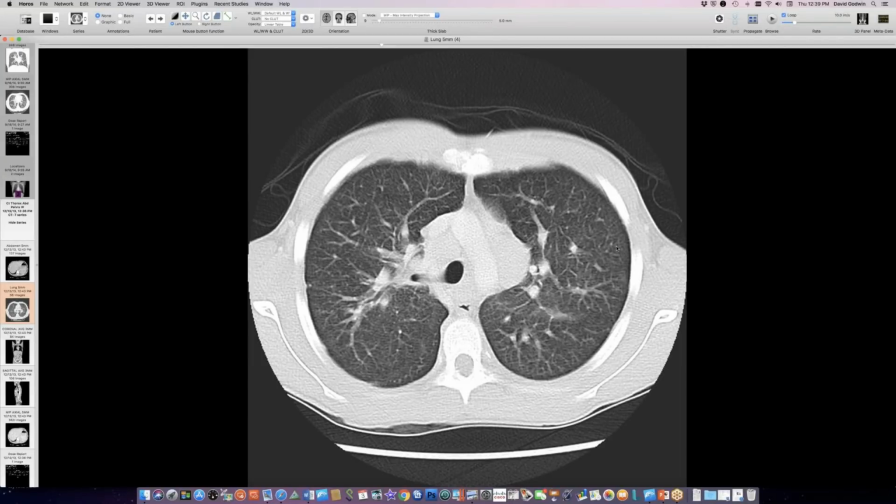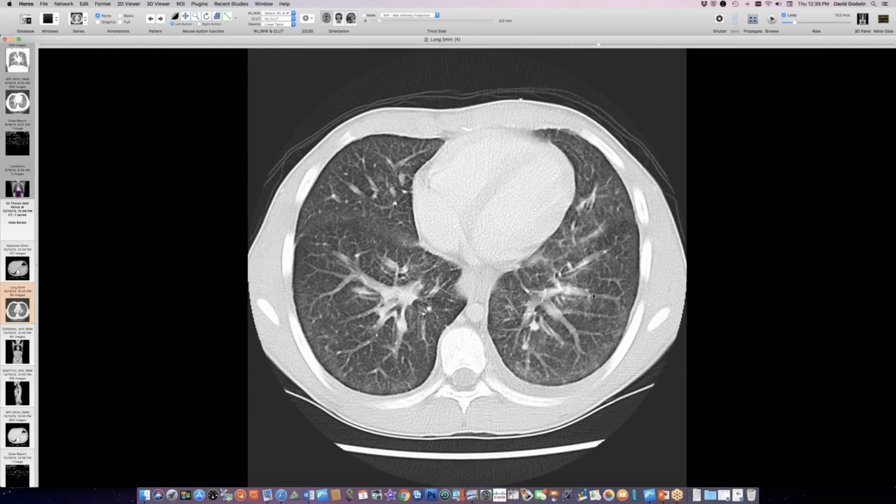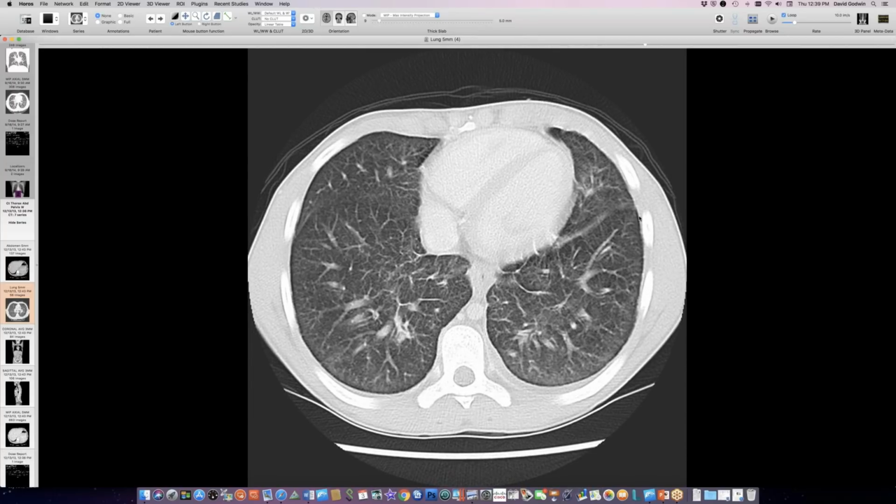So this is our currently 20-year-old, formerly at the time of this imaging, 15-year-old boy who had surgery as an infant for a complete total anomalous pulmonary venous drainage. So that's his only past medical history of note. And then he presented with a skin rash, and he had eosinophilia, and he had this chest CT. We didn't have the chest radiograph that we've retrieved.